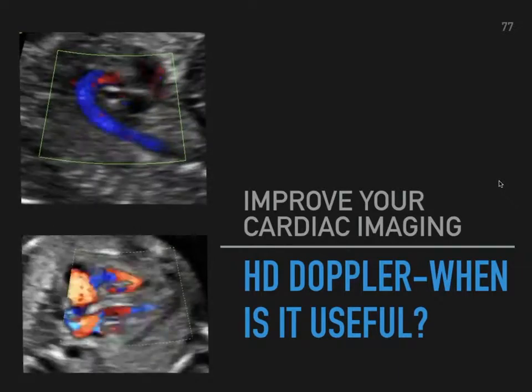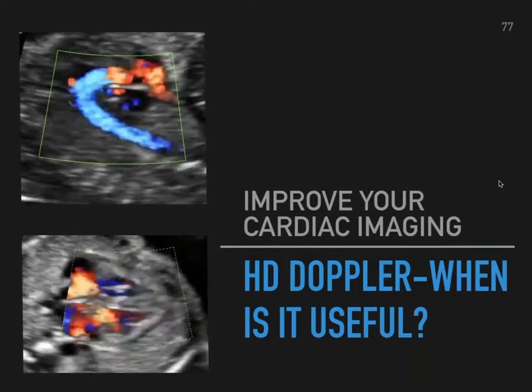So our last section is high definition Doppler. When is it useful?